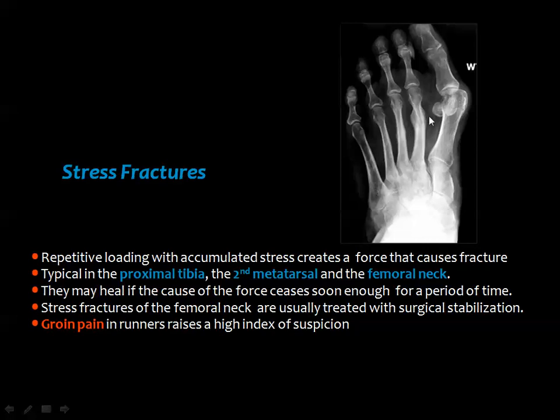The fracture heals with a prominent amount of callus, as you can see here. And the stress fractures of the femoral neck are usually treated by surgical stabilization. I will mention this in detail in the part where we deal with fractures of the lower limb. And groin pain in runners raises a high index of suspicion of fractures of the femoral neck.